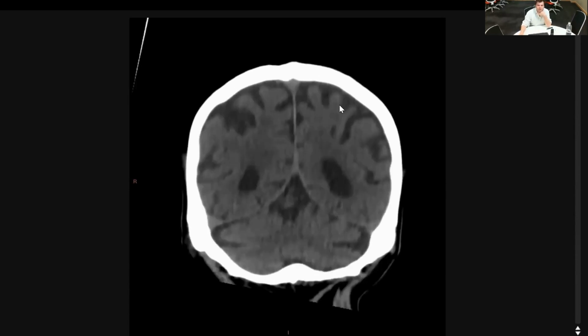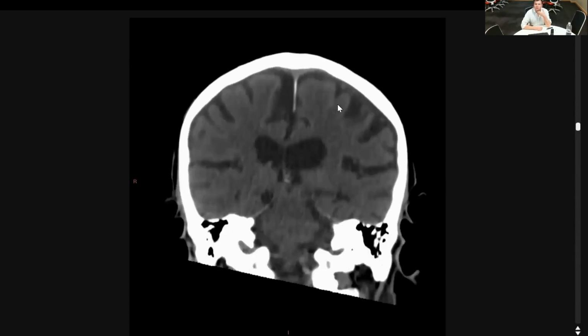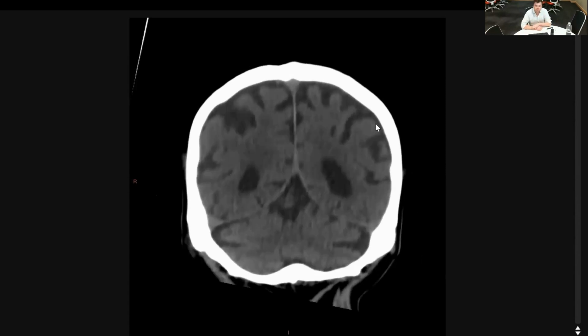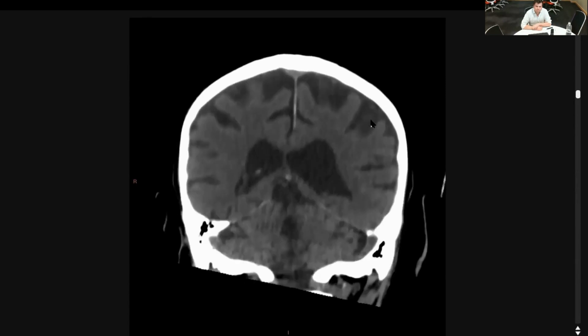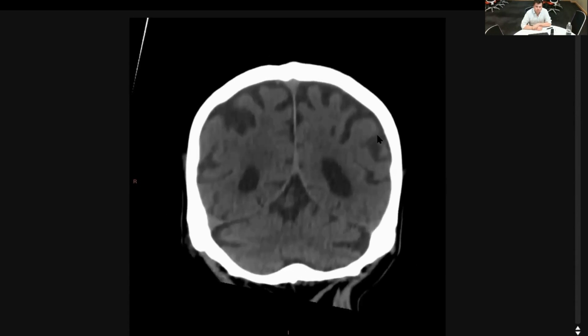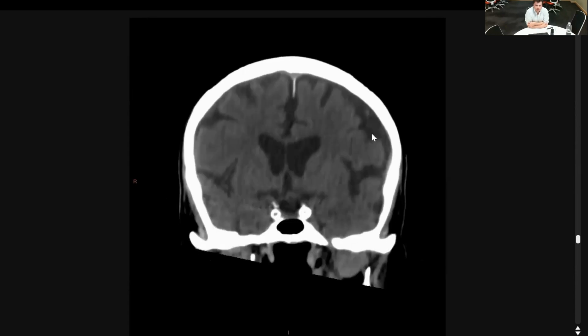What about looking around the rest of the brain now that you've seen something there? So you'd want to see if there's extension either way, but I wasn't convinced I could see an extension into the tentorium or the rest of the lobes. Okay. It's bilateral volume loss. Sometimes you can get isodense subdurals, but yeah, don't know if I'm missing something. No, it's fine. Okay, did anyone else see anything else?